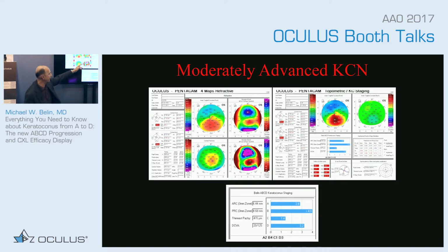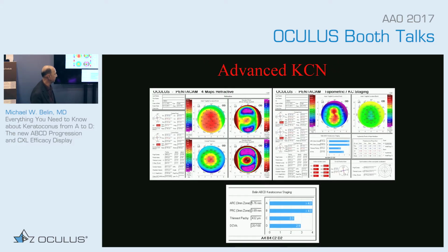And this is moderately advanced disease. Again, you can see here, and then this is markedly advanced disease.